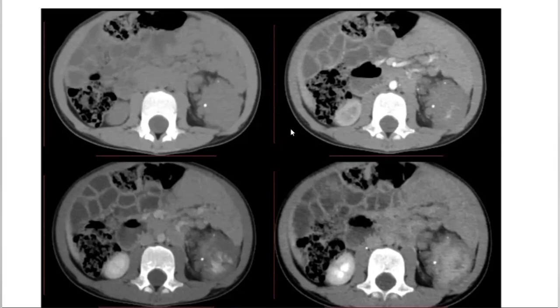This is basically a colonic lesion, and you can see there is lobulation. You can identify some calcifications within this area, and then you can see, like you said, this is enhancing in the arterial phase, then the venous phase, and the contrast is pooling in. So what is your primary diagnosis? Sir, this appears to be active bleed, and if this is a colonic lesion, I would raise the possibility of angiodysplasia.